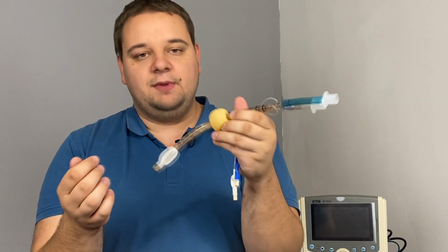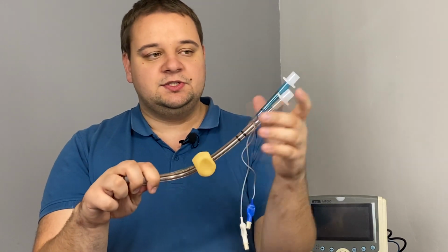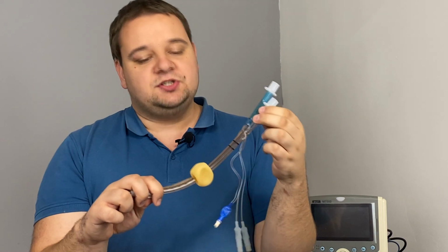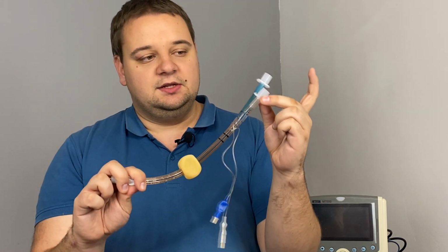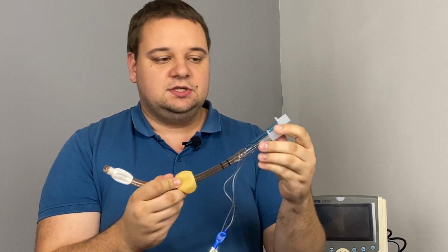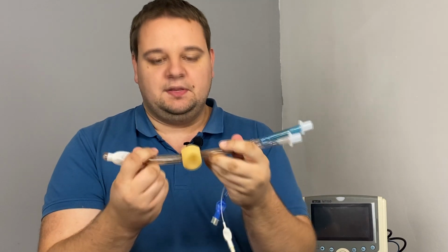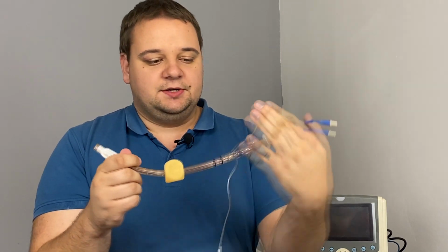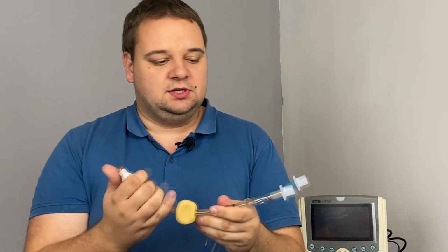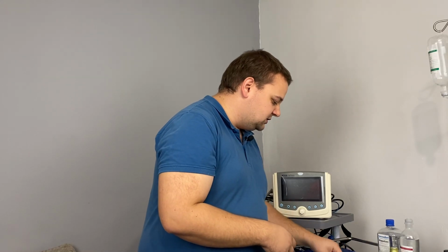But if you somehow manage to intubate the patient and get this part into the trachea, in this case it will not work. So you try to ventilate in line 1, nothing happens, then you say, okay, probably the patient is intubated. Then you switch and start ventilation in number 2, and the exit for number 2 is here on the distal part of the tube. So in this case, when you start ventilation, you will get the same effect that you have in the intubation tube. So this is actually the coolest option possible, but it's not designed for that. But still, you may continue ventilation if the patient was intubated. And that's it for the supraglottic devices.